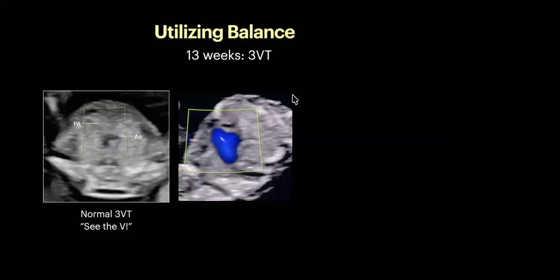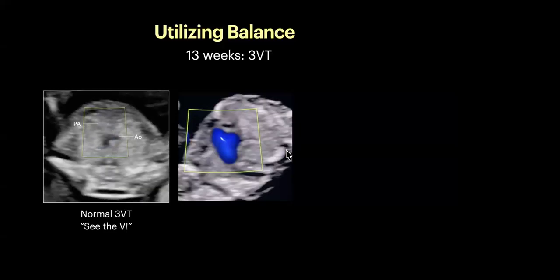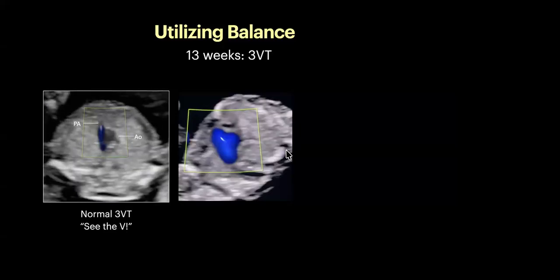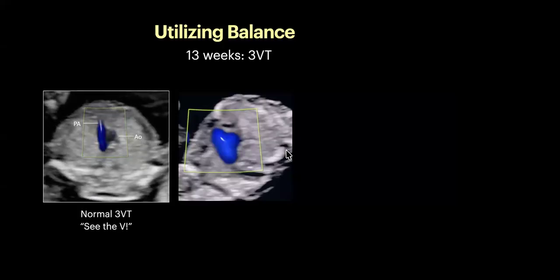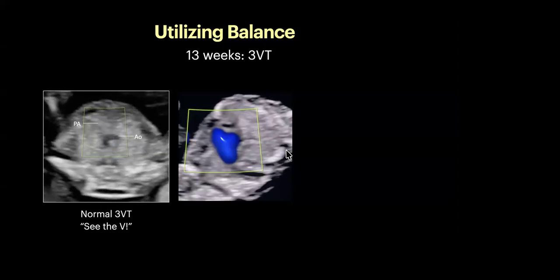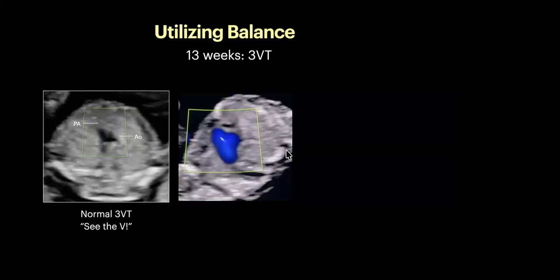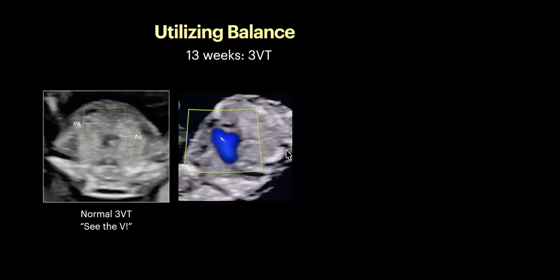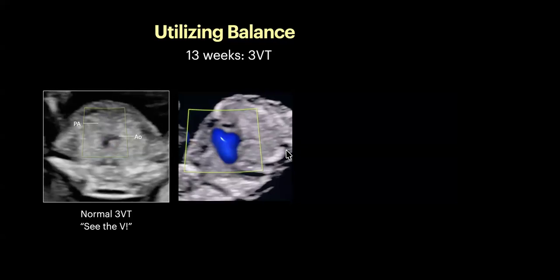And here is a case where a sonographer took the image. This is the first trimester case that was taken. The patient did come to us during the second trimester, and we did identify transposition of the great arteries. We were wondering, did we miss something during the detailed first trimester? Of course, in our lab, we have a comprehensive QA program in which we assess previous studies to see what we could do to improve our imaging.